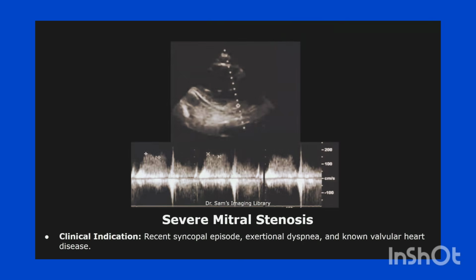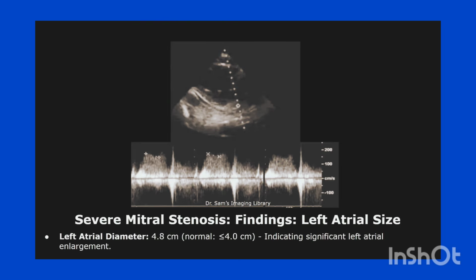This is a case of severe mitral stenosis. Clinical indications are recent syncopal episode, exertional dyspnea, and known valvular heart disease. The left atrial diameter is enlarged. It is 4.8 centimeters, indicating significant left atrial enlargement.